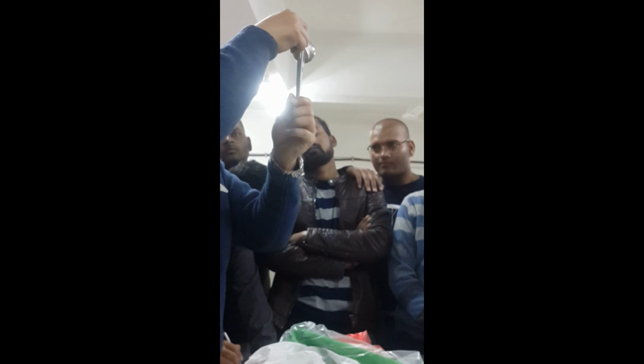But this is a prosthesis. Okay, an endoprosthesis. If you replace the limb, then it's exo. But just don't say endo or exo, just say it is a prosthesis. Okay. So what is this? Austin Moore implant. You have to know the fenestrations, and there is a hole for extraction. So this is the head, this is the neck, this is the stem, and two fenestrations, and the other hole for extraction of the implant.